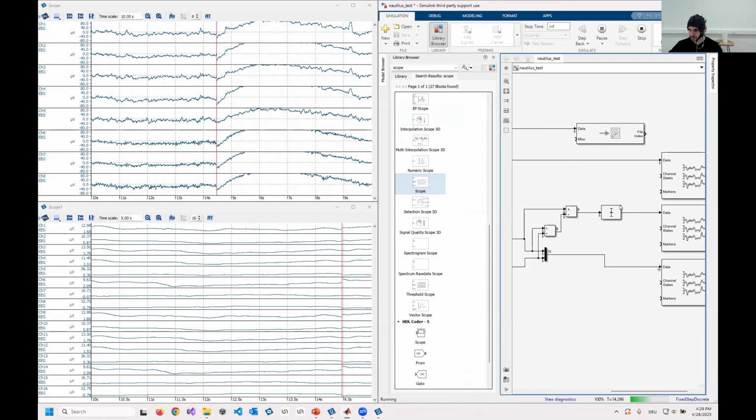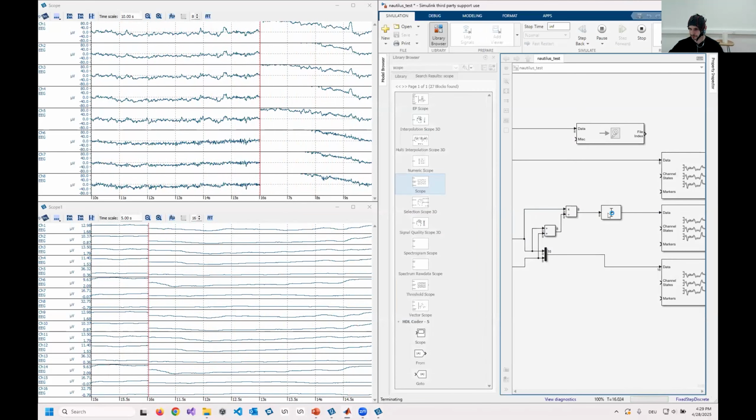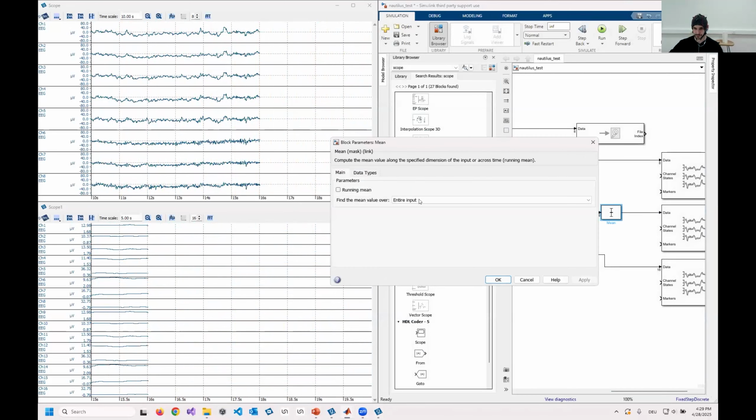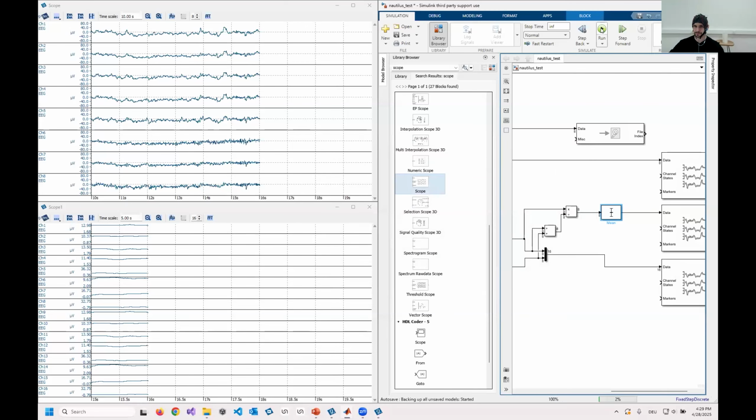It's like I've misconfigured the one node. Try it again.